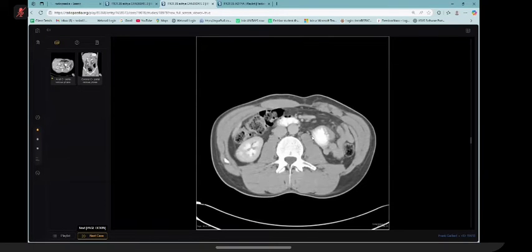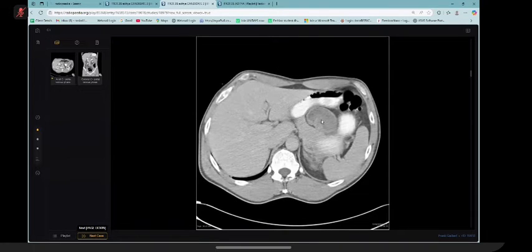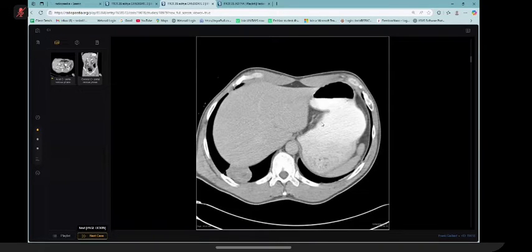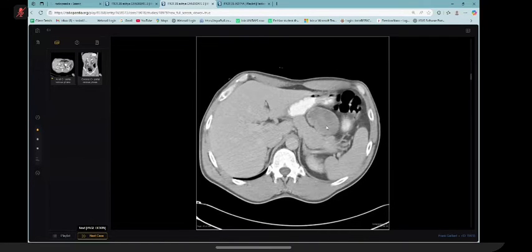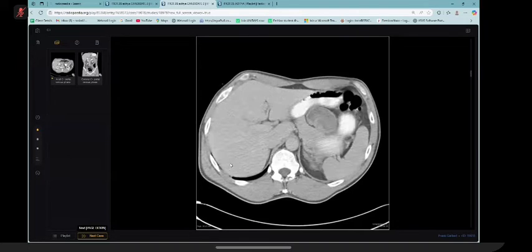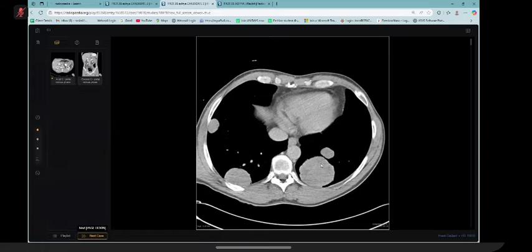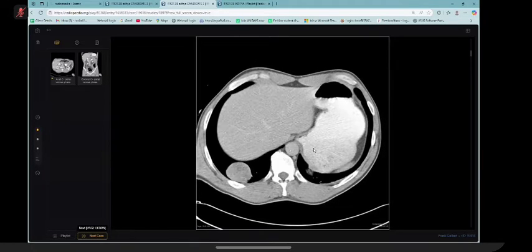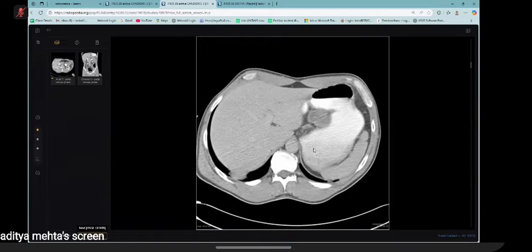In summary, in this patient, there is presence of invagination of one loop of the bowel with the other, with a small nodule in the right lung base. In my routine practice, also there are multiple deposits in bilateral lung fields. This likely suggests metastasis. In my routine practice, I will go through the lung window and also like to see the coronal images to further confirm my findings.